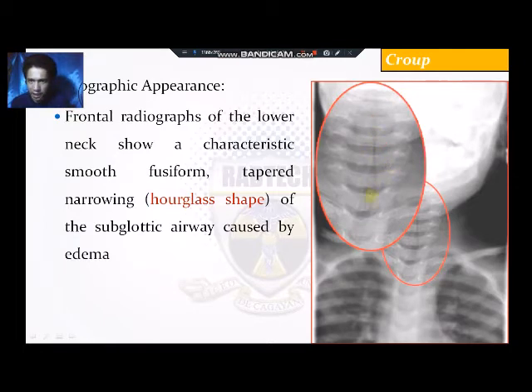Okay, so kanang gamay na lang kayong gaitom ana. So kanang gamay nga gaitom dara, kaning radiolucent nga appearance niya, that's actually the passage of air. So just imagine nga na lang kagamay ang passage of air. Nga na lang kagamay ang air passage or the passage of air as it will enter no the bronchial system of the patient, and then nga na pud kagamay ang gianan paggawas sa hangin as the patient will exhale.